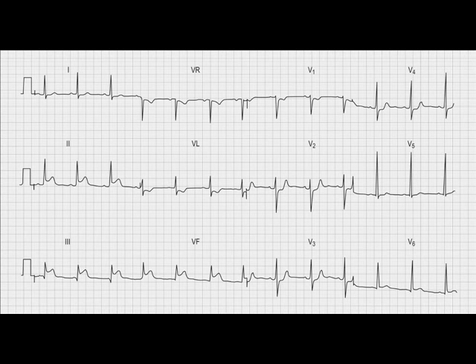Measure the heart rate. Check it's regular, as we've described right the way along. So again, mark off 2 R waves next to each other on a piece of paper, move it along, and the subsequent R waves should fit. It is regular, and I'm counting there 4 large squares between 1 R wave and the next. So we have a heart rate of 75, nice steady heart rate, and they're in sinus rhythm. So it's not sinus tachycardia, it's not sinus bradycardia.